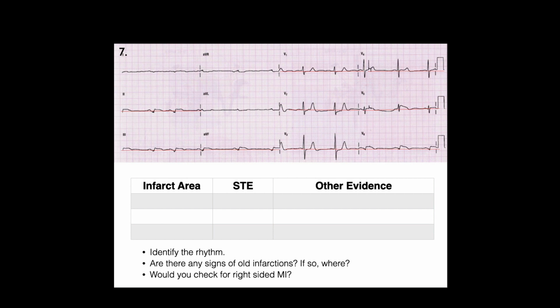I don't really know what the rhythm is, but anybody know what the rhythm is? It's a Brady rhythm. Oh, say it again. I just looked on it. Oh, you just looked. Yeah, if you looked, it said I cheated, so you could cheat too.